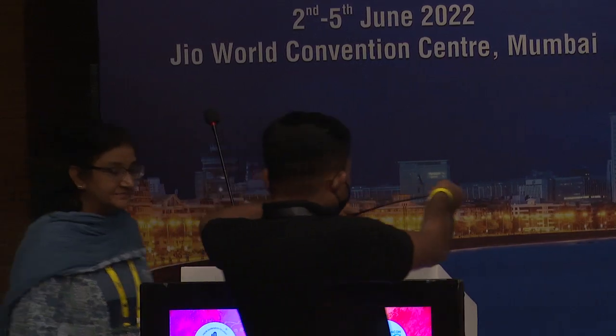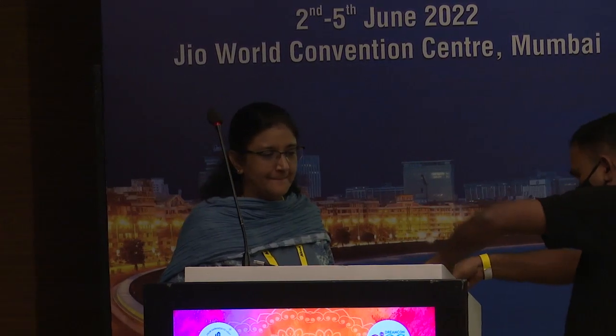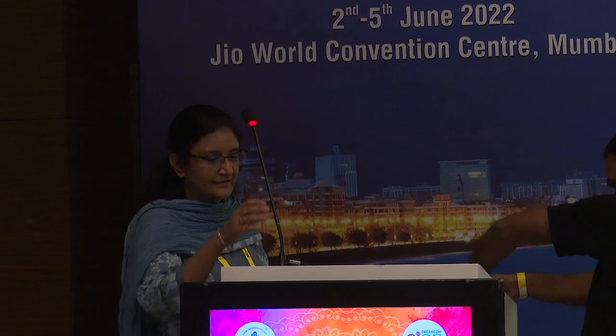Yes, Dr. Manisha, please tell us about the importance of OCTA, even with having OCT and FFA for diabetic retinopathy.